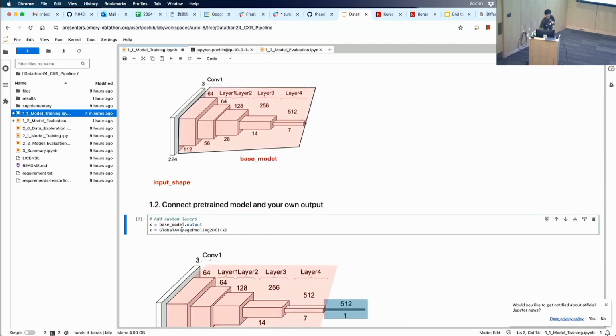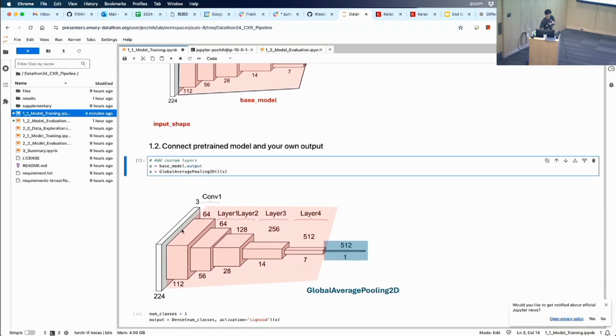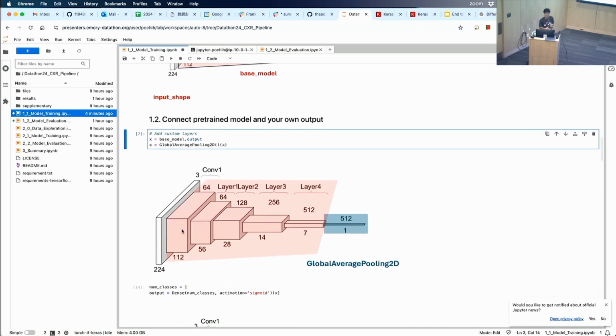So is everyone still with me? Do people understand up to that, at least the people who haven't worked with medical imaging data? Where are people stranded? Are people even able to load anything, or are they still loading the library? Loading the library, that's okay. I was able to run through my terminal and install all the things, and I don't have the errors.